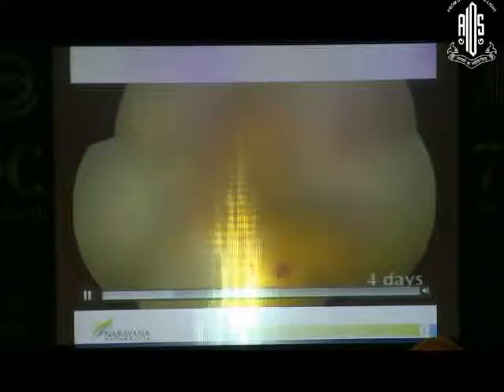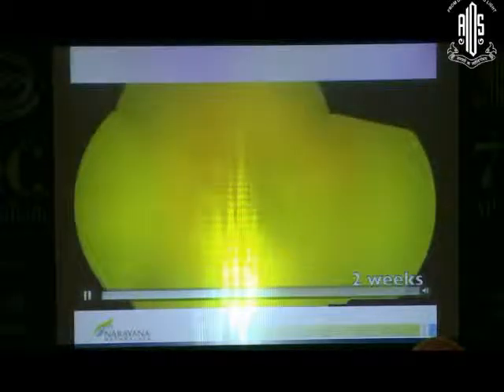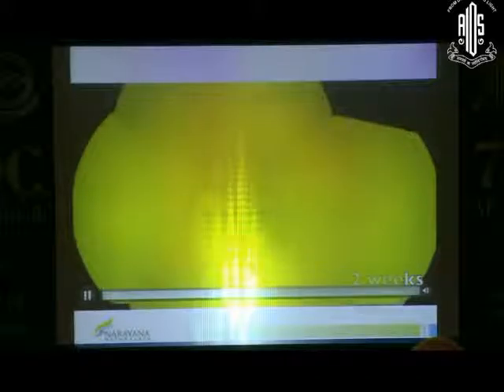So the APROP does well. You can see this is a montage, so a massive amount of the periphery is avascular. At 4 days, the plus is coming down, the vascularization goes further, 1 week, 2 weeks. I just want you to keep your eyes on 8 or 10 weeks, when what happens is you see a recurrence. Now, even the BEAT-ROP study showed that recurrences can happen as late. So that's 10 weeks, you can see early NVE, and then by 11 it's actually bleeding.